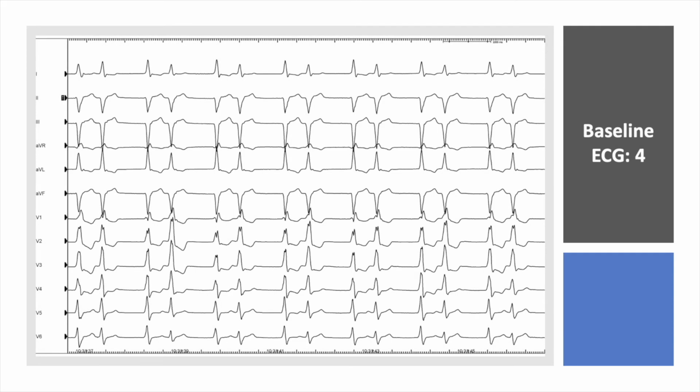This is the last ECG of this patient during tachycardia that we see together, which again shows group beating, and most probably, as we explained in previous ECGs, we have a sustained ventricular tachycardia with exit block at the ventricular circuit. Most probably in this case the exit block was at the more septal exit, and we only see the second morphology, which is more inferior compared to the first morphology.